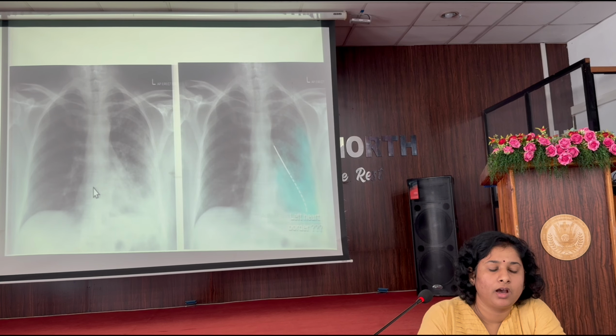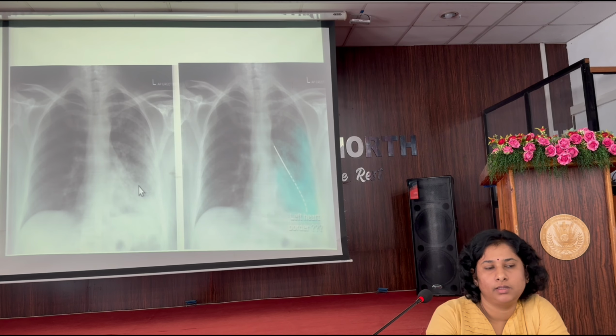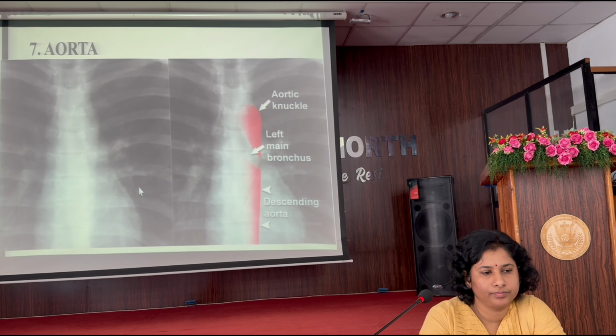Here the heart border silhouette is lost in the left side, and there is some consolidation, airspace opacification, and air bronchogram is there. So the patient came with fever, so this is due to the lingular lobe consolidation.